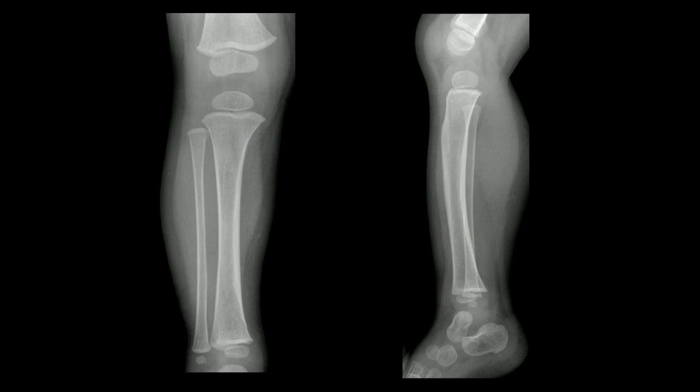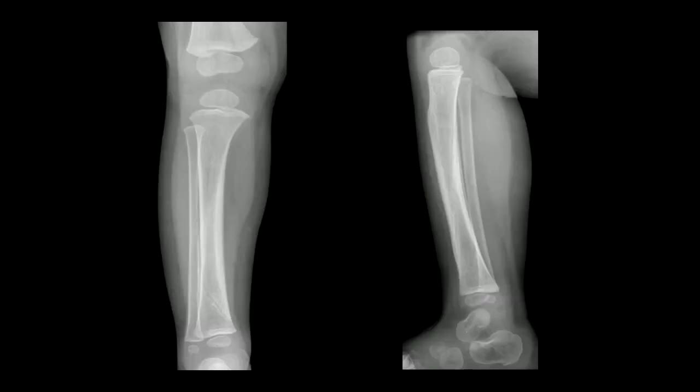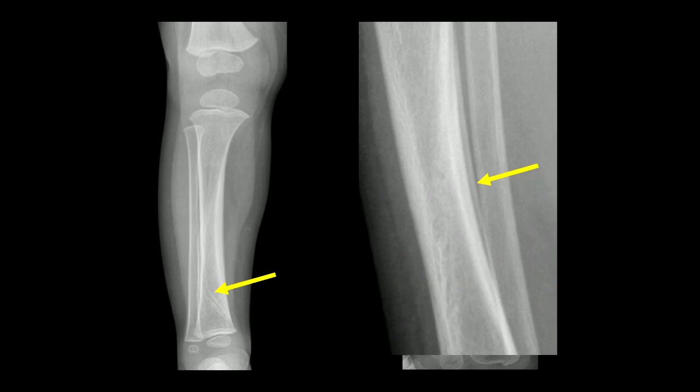On radiographs, a toddler fracture may not necessarily be evident at presentation, as in these frontal and lateral radiographs of the leg in a young child who stopped bearing weight without known injury. However, at follow-up at approximately 12 days' time, we can see that the fracture line is more evident. There is surrounding sclerosis of the spiral or oblique fracture, and there is periosteal new bone formation indicative of the fracture.